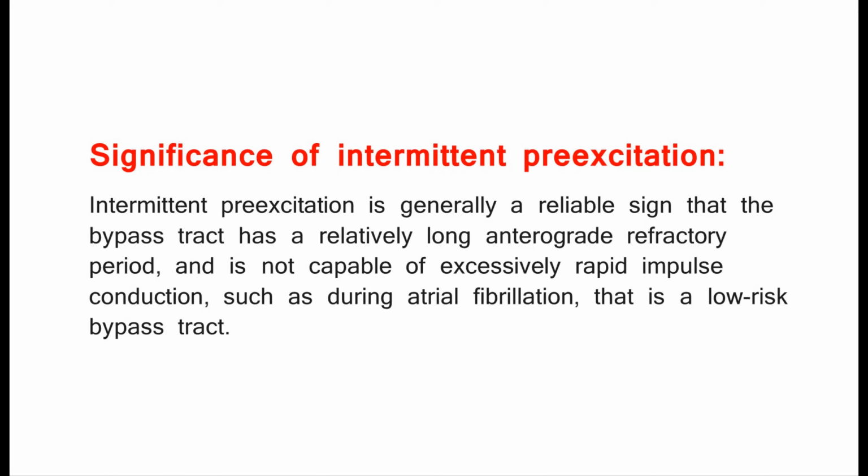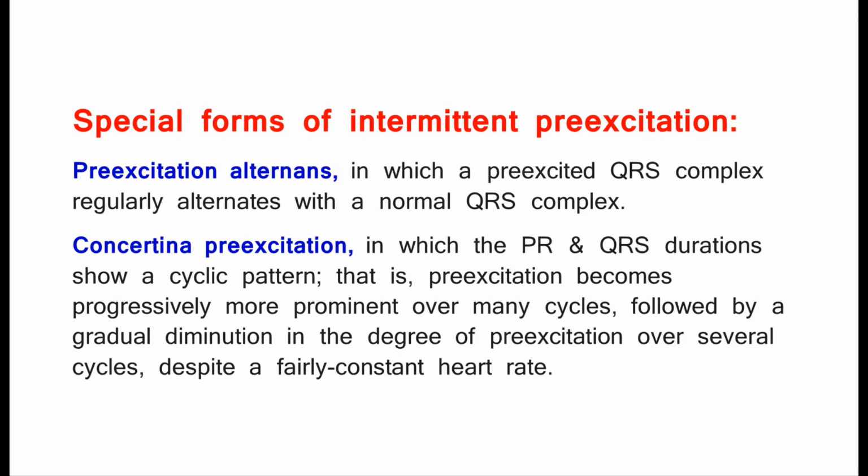Significance of intermittent preexcitation. Intermittent preexcitation is generally a reliable sign that the bypass tract has a relatively long anterograde refractory period, and is not capable of excessively rapid impulse conduction, such as during atrial fibrillation, that is, a low-risk bypass tract.